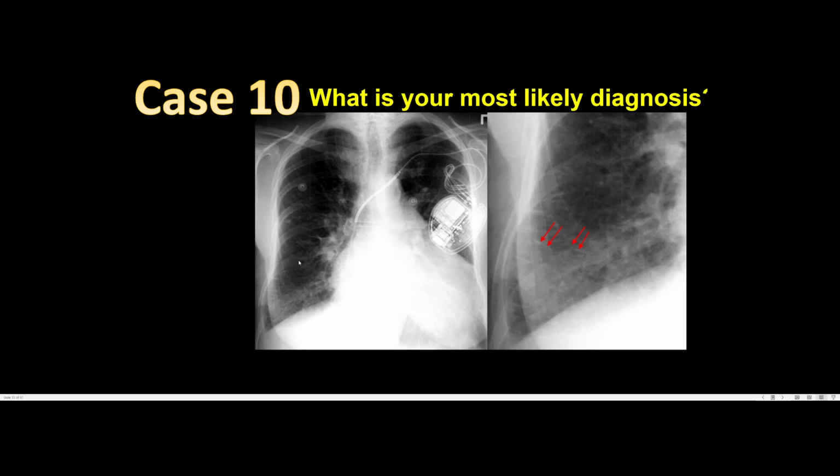Like we said in previous videos, oftentimes the lung parenchyma is composed of pulmonary blood vessels, which are very obvious in the center. But as these pulmonary blood vessels divide towards the periphery, they become smaller and smaller in appearance because they distribute themselves towards the periphery. They become smaller, less obvious, less white in appearance and density.